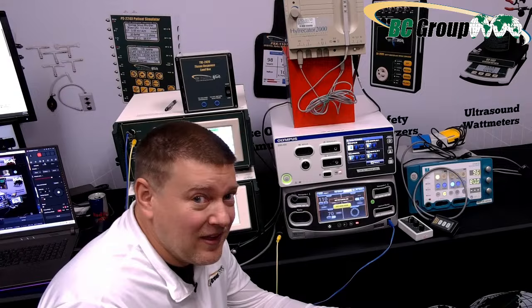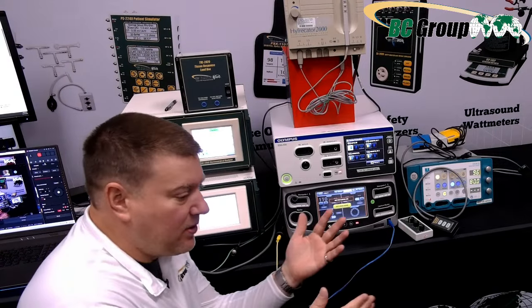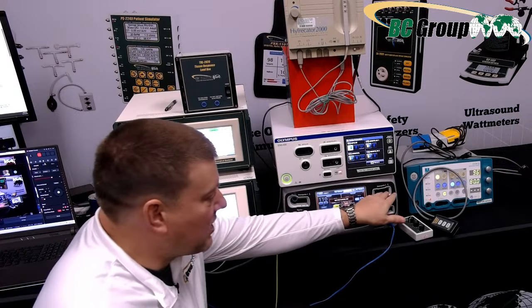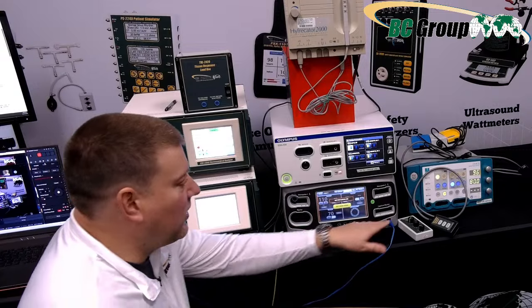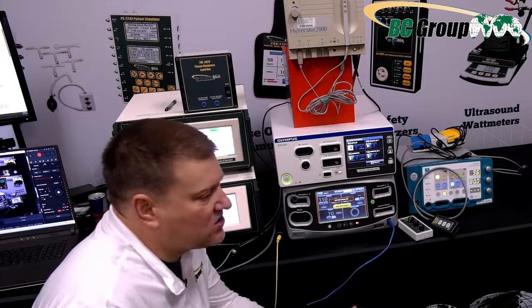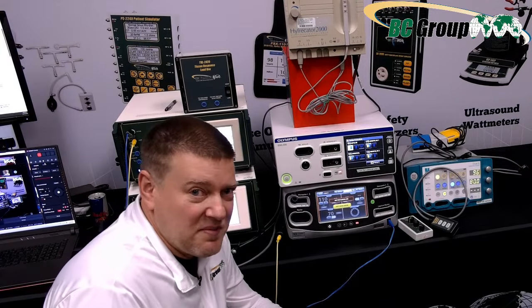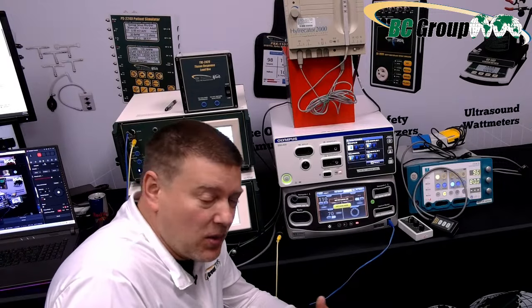That's crazy. I remember back when I was doing ESUs, we would have a paper chart, and we would have to sit there and fill out monopolar 1, monopolar 2, all the different energy levels, and then bipolar, and then ligature, and then the CQM, all your different results. And then we'd have to go back and transcribe that into the record, into your CMMS, which was absolute garbage, but we had to do it, right? Because there was no other option.